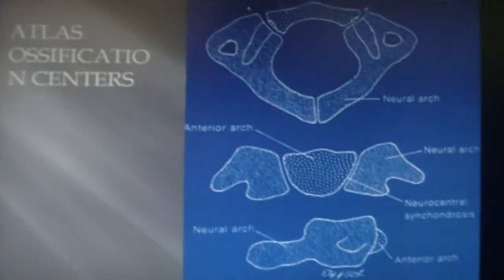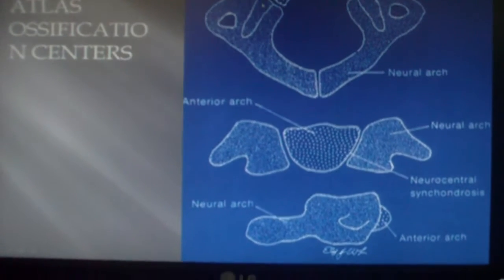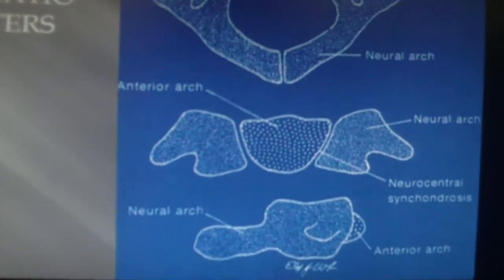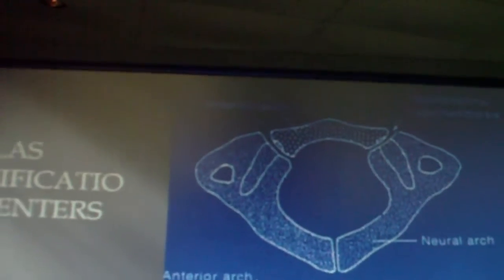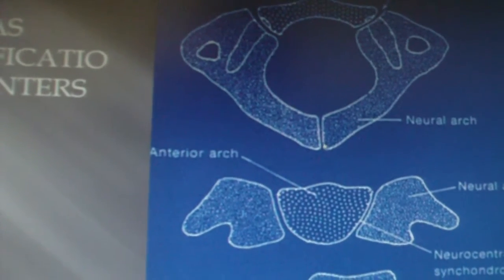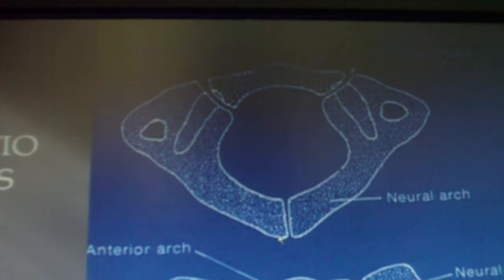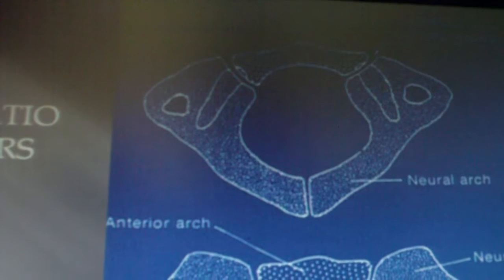Anyhow, we have synchondrosis here, right? So realize that these locations are where you can have persistent non-union. There's cartilage there, but it's not as strong as bone. So these are areas that could, you know, because of stress, become separated. So just kind of know where they exist. This one you're not going to have any trouble with. It would manifest as a spina bifida. And what do we call it if it's going to be C1, as this is? Spondyloschisis, right?